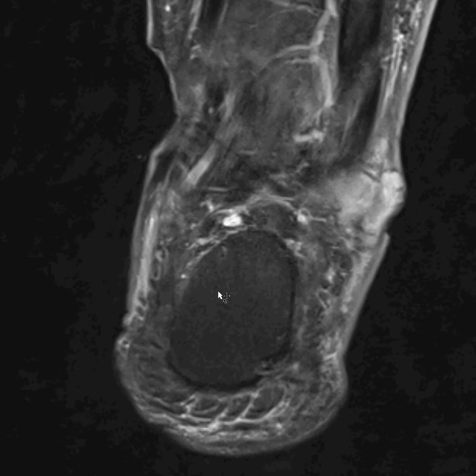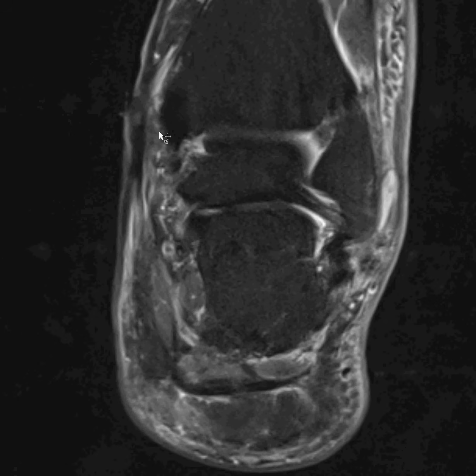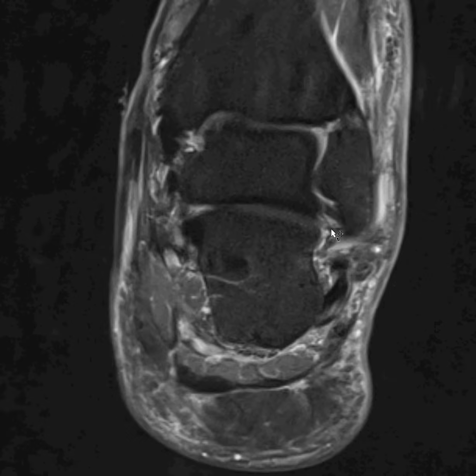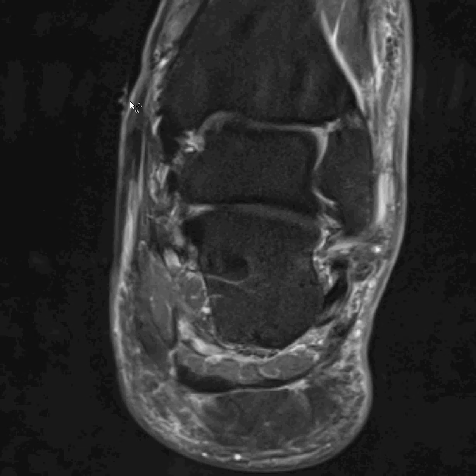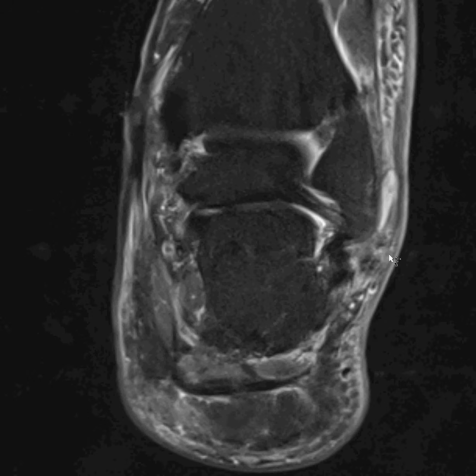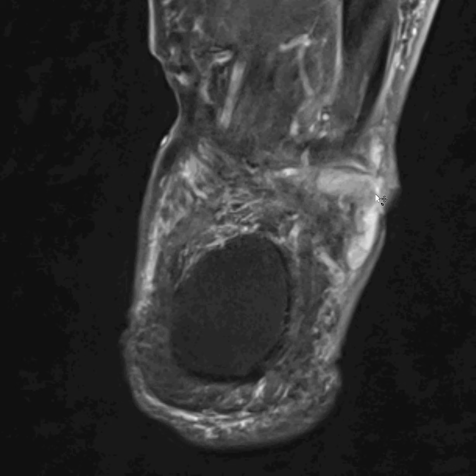So here you can see a big skin defect. That is an ulcer. And what you're looking for are bone changes nearby and also fluid collection changes. Now, it happens to be that also on the other side of the ankle, this is the medial ankle, this is the lateral ankle, and at these bony protuberances, the malleoli, is where we often get these ulcers. So there's another ulcer out here, and you can actually see what is a fluid collection in this area.